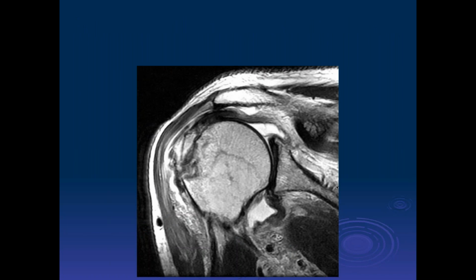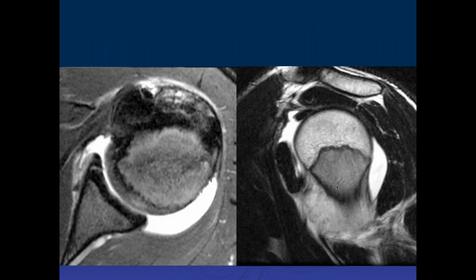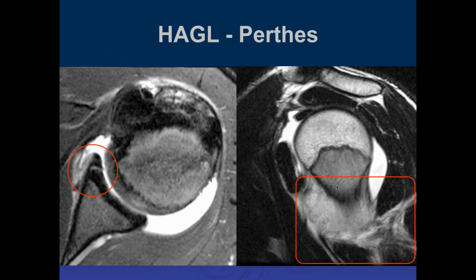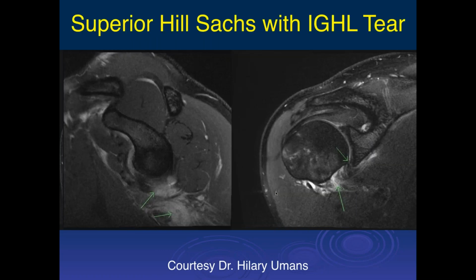Okay. So what do you think of this? The avulsion is from the humerus, isn't it? Well, in this case, oops, go back here. In this case, the humeral attachment here, I think, is intact. I think that inferior glenohumeral ligament's abnormal. I think the tear is out here. And I think some of the glenoid attachment is intact. So this was, I think, kind of a mid-substance tear of the capsule down there. Okay.